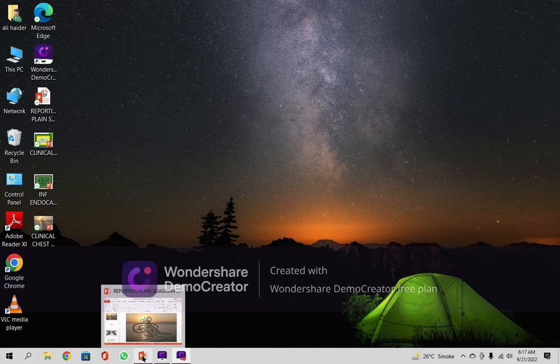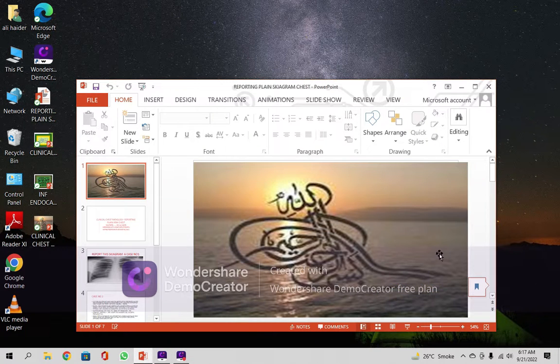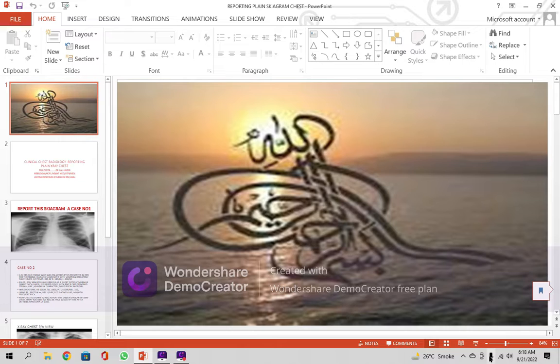Now today again it is case number 2, reporting X-ray, which I am doing plain X-ray. A series of 5 or 7 X-rays I will report one by one, so you can understand well the problem which the X-ray actually shows. Plain X-ray is one of the diagnostic tools we have.